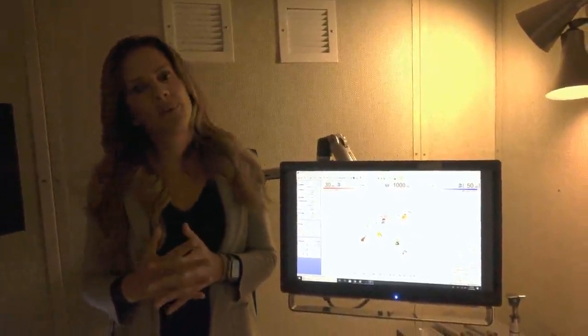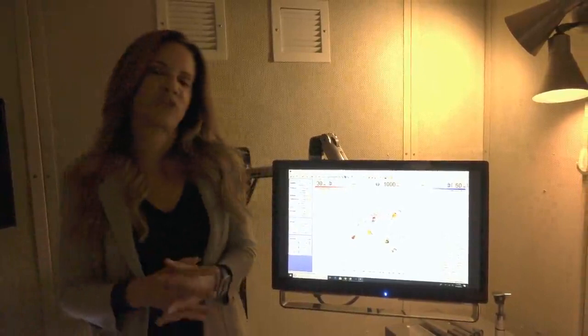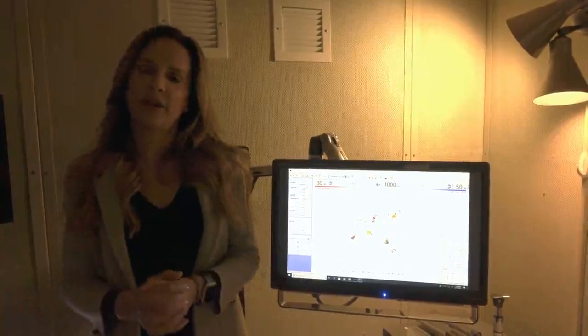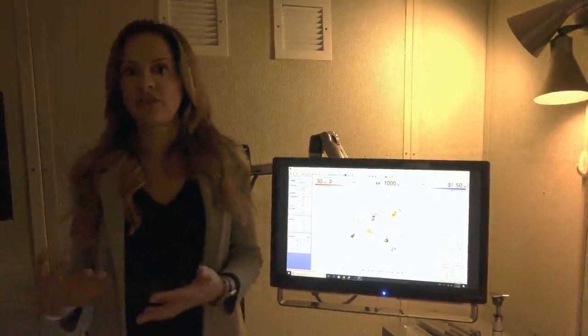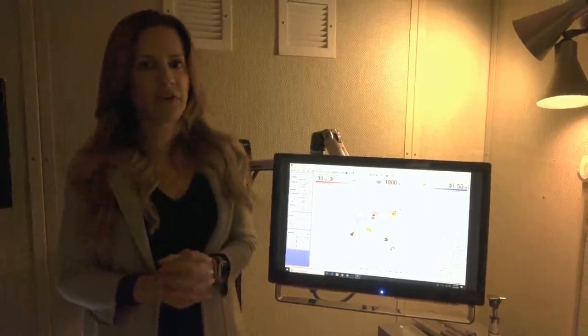So in part 1, what we showed you was certain testing protocols, the beeps, the words, even getting your ears tested with this little machine to my right. But what happens afterwards? How do you understand what the test is all about? What we're going to go through today is the summary and expectations or recommendations that we can provide for you. So on the screen right here, what you see is an audiogram.